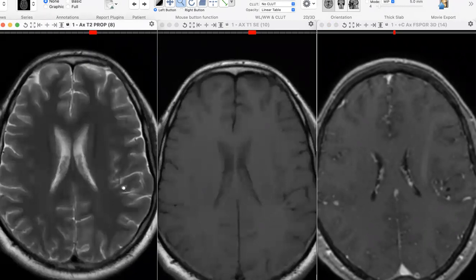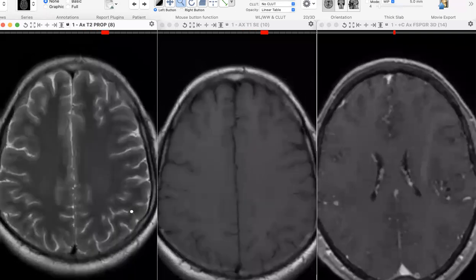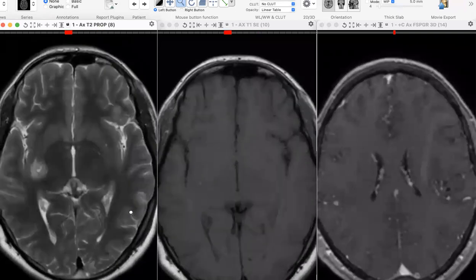So this is the vesicular stage. This is clean fluid, almost CSF intensity. On FLAIR, it will show suppression. It will be just CSF fluid. Once it dies, however, now the problems start to happen. First of all, the fluid within the cyst becomes proteinaceous. It becomes murky. It is called colloid.